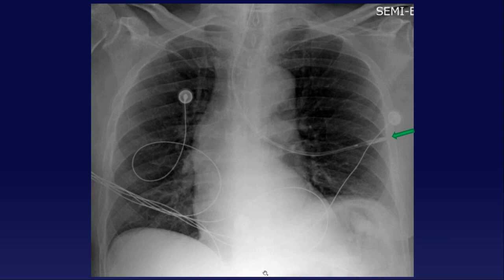Did it go down the larynx? Did it rupture the esophagus? No, that went into... Oh, it went down. Yeah, it went into the trachea. The esophagus is pretty robust. You know what I mean? I mean, it handles food.